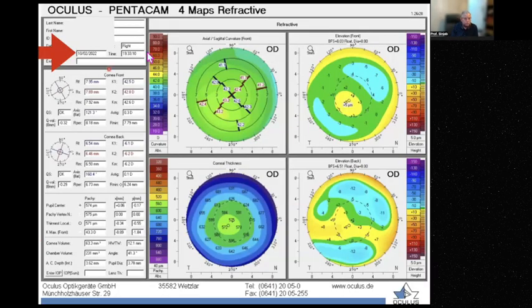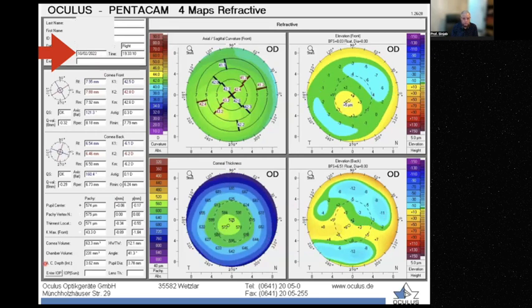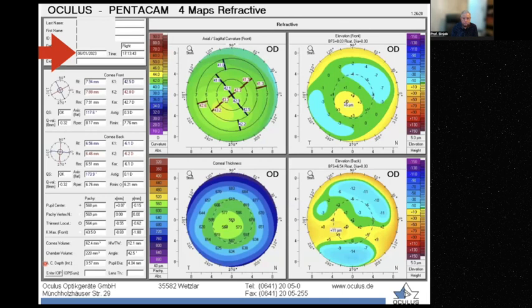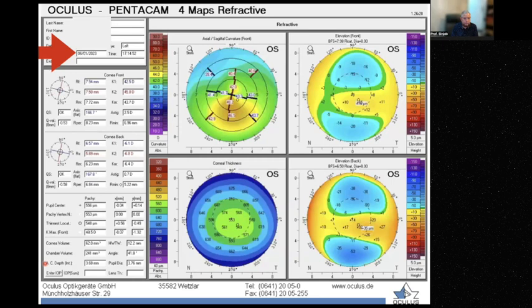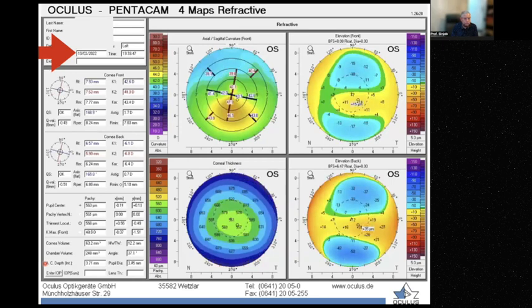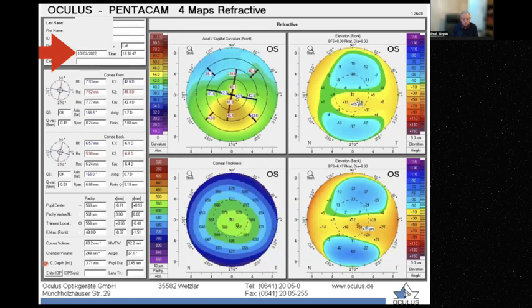This is the topography of the patient in February 2022, right eye. Now look, right eye before a year, after a year. You see, maybe some changes, small, minor changes. You may say, no, it is stable. And let's see the left eye, 1 year before, 1 year after. So you can say similar.